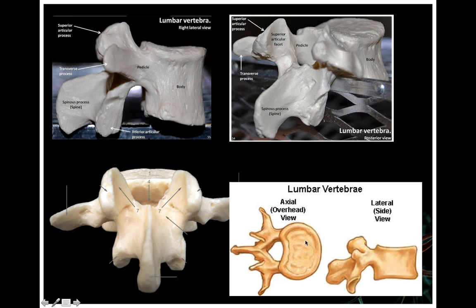See the end plate, the depression on top. This is where the disc sits, okay? And the disc can herniate back this way, or it can actually herniate through the end plate. And some authors believe that herniation through the end plate is more common.